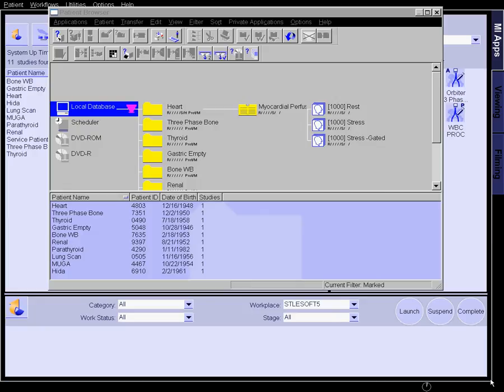examination, things like that. Now, this workstation is only used for processing. It's not used for acquiring. So there's going to be some things on here we don't actually use. So it's not that I'm not explaining them, it's that it's not necessary on this workstation. Acquisition and workstations are completely different. However, these workstations could be unplugged and hooked directly up to a gamma camera, and in those cases you would use those other tools, but I'm not going to spend a lot of time explaining those things.